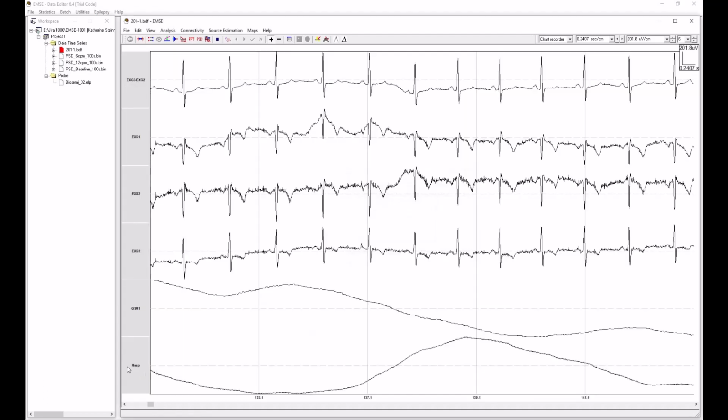Okay. We'll ignore those, but when I do the power spectral analysis for the respiration channel down here, who knows, it might be interesting to see what the same results are on these other channels. So okay, let's see what we want.